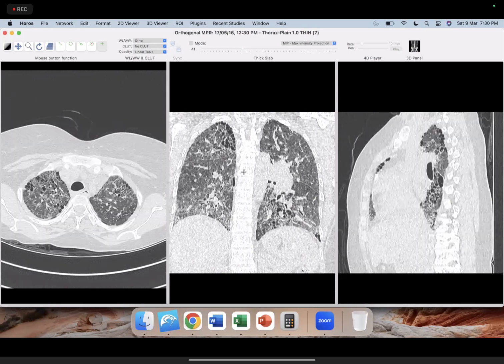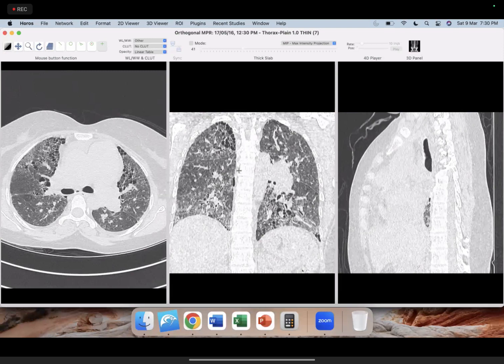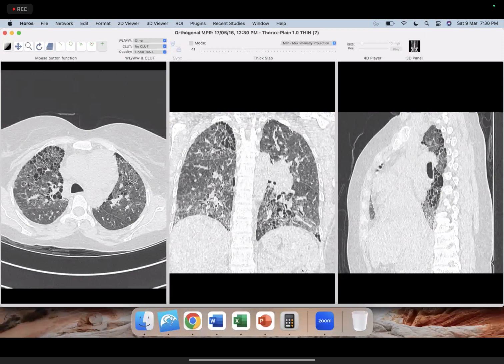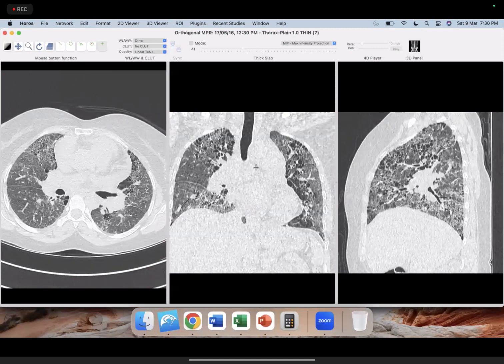We just use the terms fibrotic or non-fibrotic, and like in this case, you can even have both coexisting. So here we will call this a chronic HP with both fibrotic and non-fibrotic component. The non-fibrotic component, that's the ground glass with nodules, can be even acute exacerbation or a part of chronic process for which you need a previous scan.